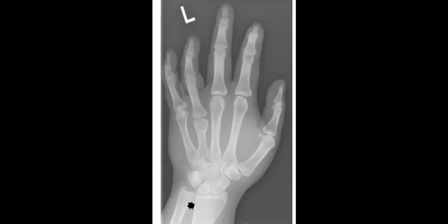Pseudo hypopara. So there is shortening of the fourth metacarpal, no associated Madelung deformity, everything otherwise clear and normal. The patient didn't have anything like trauma, surgery. So then you are going to mention that it will be pseudo hypoparathyroidism. Yeah, okay. If this patient is female, maybe you can consider Turner syndrome. Turner, yes.